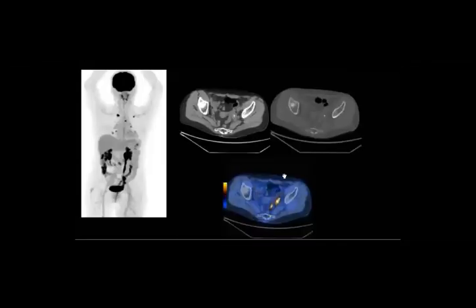Now I think we have the... I see that most of you are sleeping, so let's go to the last stage today, which is some PET-CT cases. We have about 8 minutes. So try to collect the findings. This patient, 60 years old, he already did like operation, and they made PET-CT to make follow-up staging, restaging for this patient.